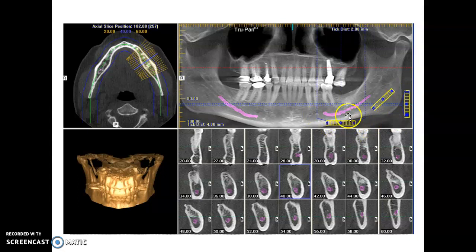You've got your three blue lines going up vertically with this little scale going here. This is that scale repeated. Those are slices and views as well. This blue line that's running in the center is this blue line here. So this point of this image is this same point of that image.